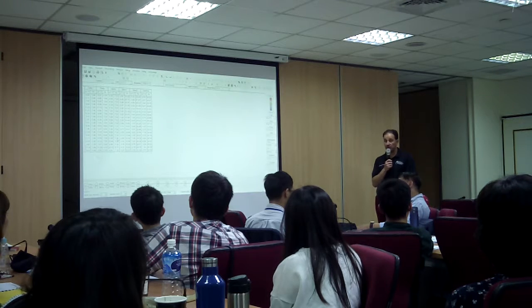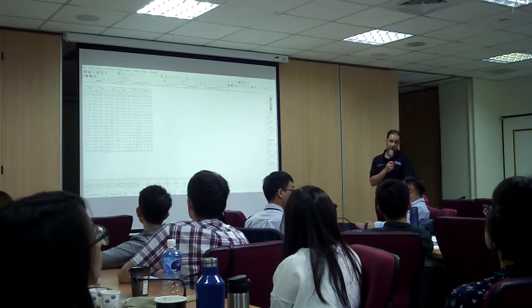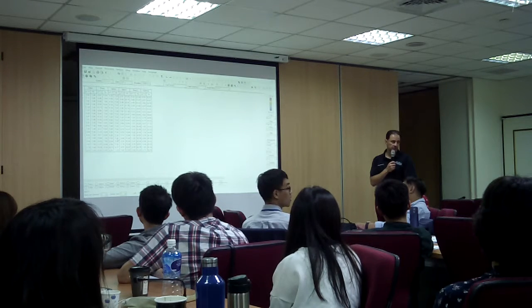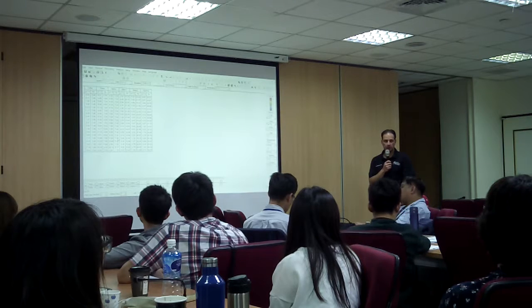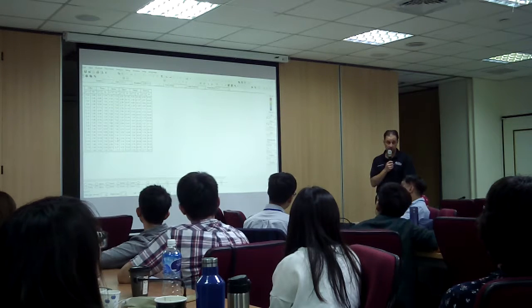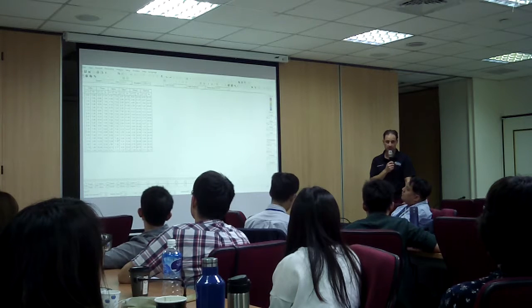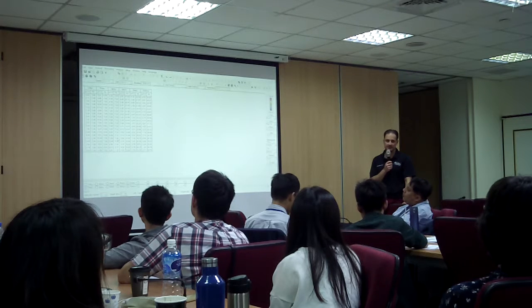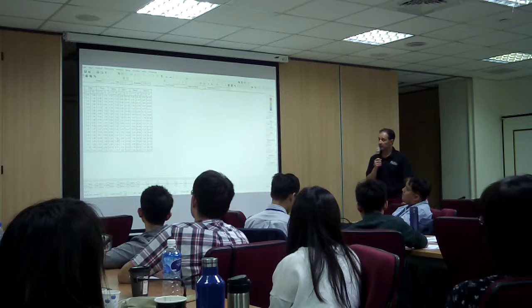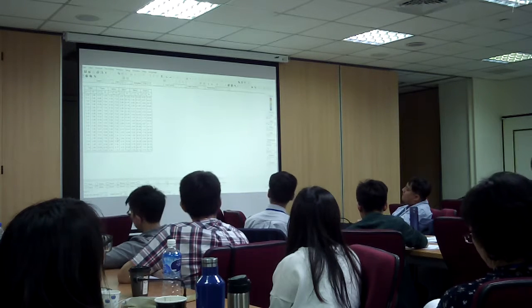So we do the pharmacological route as well because we want to stop the discharges, and we do neurofeedback. So the neurologist, and I, well, it's mostly the neurologist, will decide when to start reducing the dosage and taking the medication completely. I don't decide that. The prescribing professional does, based on what the EEG is saying, right? So we have that, and let's look at the spectral analysis.